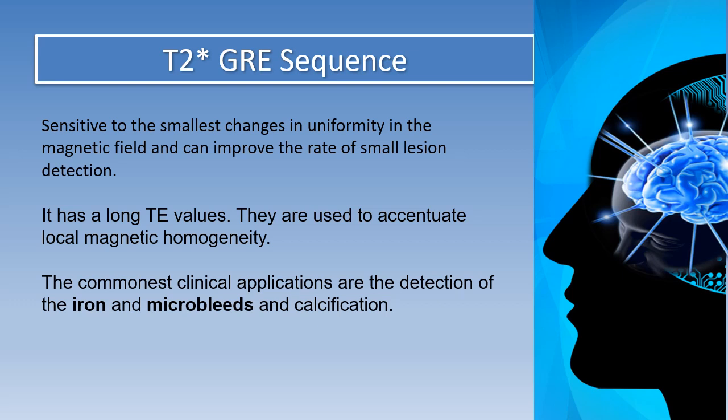Additionally, the commonest clinical applications are the detection of iron microbleeds and calcification.